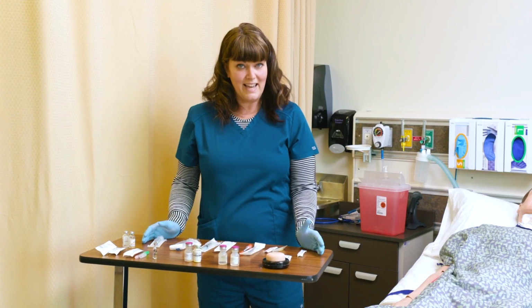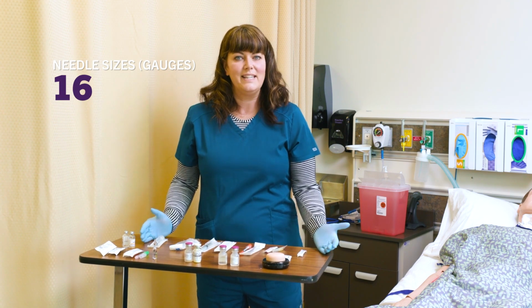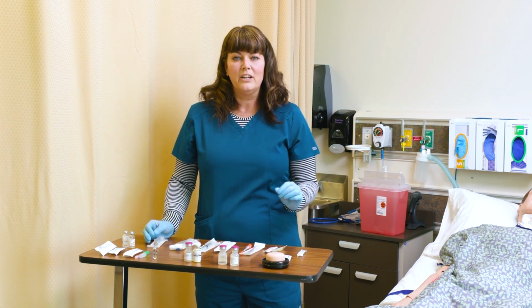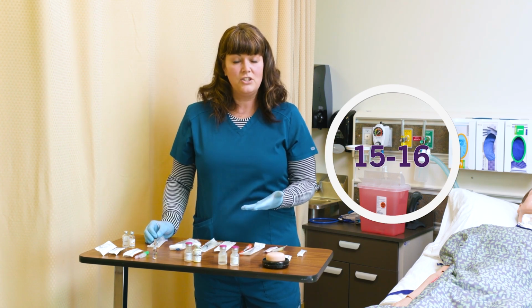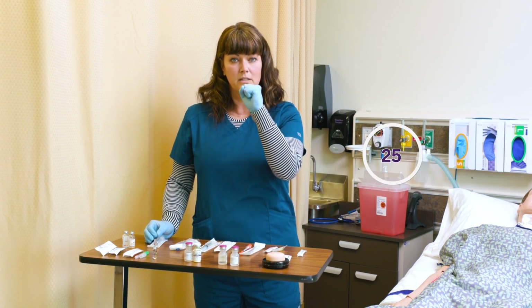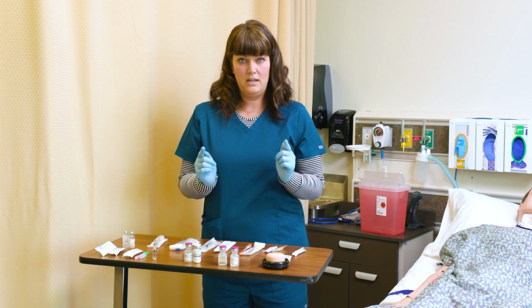So, needle sizes come in gauges. They start at about 15, 16 gauge and go all the way up to 25 gauge. The thing to remember here is the larger the number, the smaller the size. So a 15, 16 gauge needle will be very large, where a 25 gauge needle will be very small and thin.